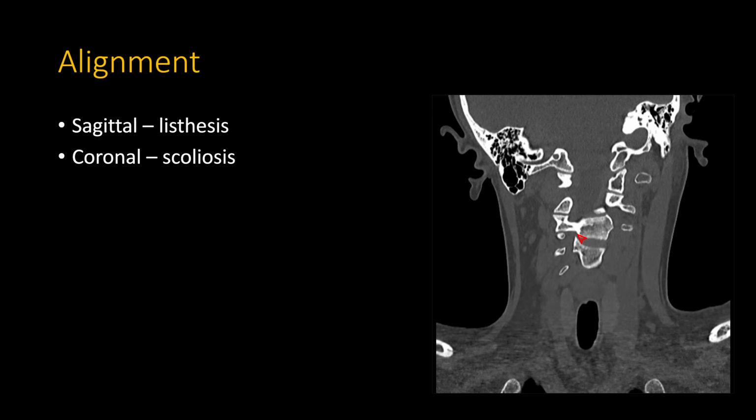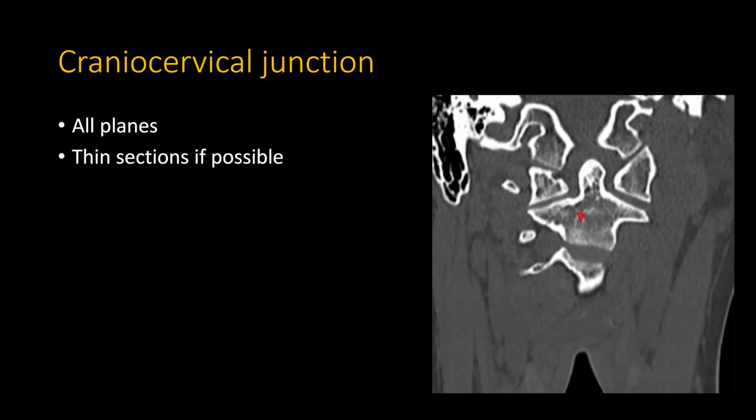This is in contrast to radiographs, where positioning is quite standardized. You have standing radiographs, supine radiographs, bending radiographs, etc. So following alignment on radiographs makes sense. On CT, following alignment doesn't make as much sense as on radiographs.